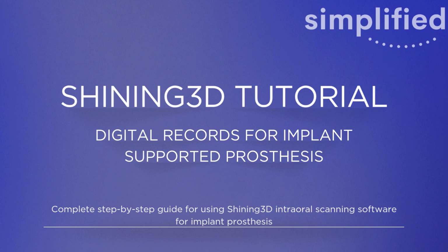This presentation will guide you through the step-by-step process of setting up a case using your Shining3D scanner, and provide key insights to help you achieve seamless, accurate results every time.